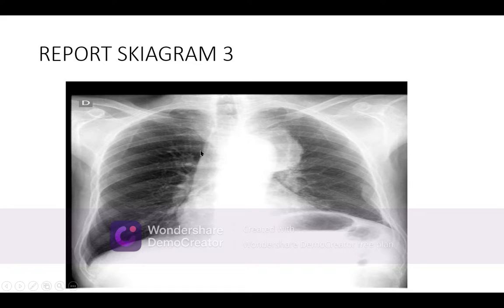This is the margin of the aorta. Here this is going on like this. Look, my cursor is moving like this, and this, and this, and coming back. It means that it is a superior mediastinal or anterior mediastinal shadow, definitely. Some of the part is in the superior mediastinum, but the rest is probably in the inferior mediastinum.